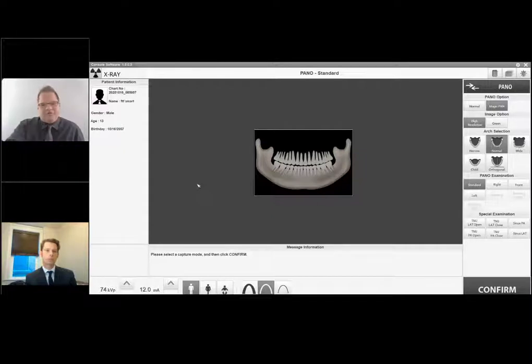So, I mean, everybody who's taking Panos with our units is probably familiar with this screen, but there may be certain things in here that you don't know. So that's what I think we kind of want to highlight here. So it has the patient demographic information on the left side if you're integrating directly into our software there, and it will pull the sex on the bottom. So on the bottom there, we can see it shows based on the patient's age. It will choose man, woman, child.